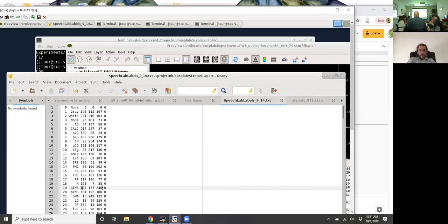I think the rule was treating those RGB values as a base 256 number. So basically multiplies the first by 256 squared, and then the second by 256, and the third by 1. I think. Yeah. Because these numbers are always from 0 to 255, each of them. Yeah.